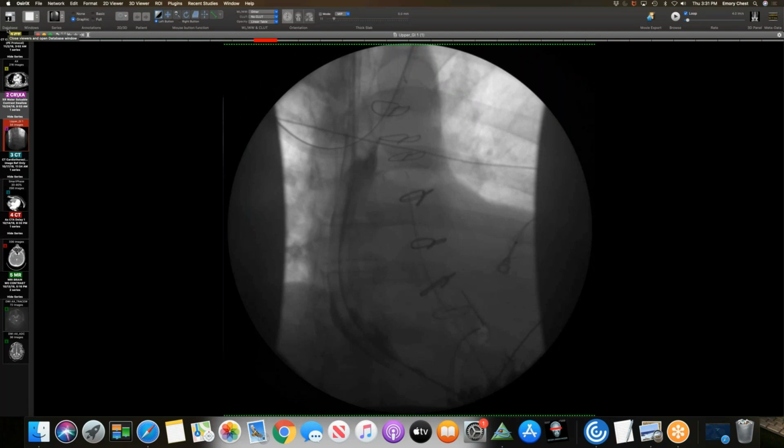Yep, it's an example. Howard, you've seen probably a half dozen of these, as have I? Maybe not quite that much. Maybe about 4 or 5, I think. We did an exhibit, didn't we? I think that Jeff did that, or you did. Yeah, we had it in that SD one. Between us, we had about a half a dozen cases of different kinds. Peter, can you go back to the coronary CT?